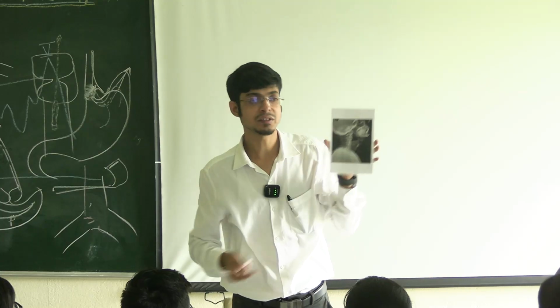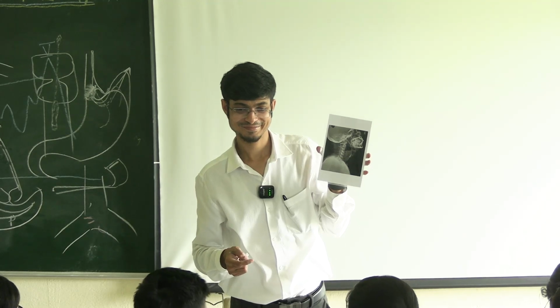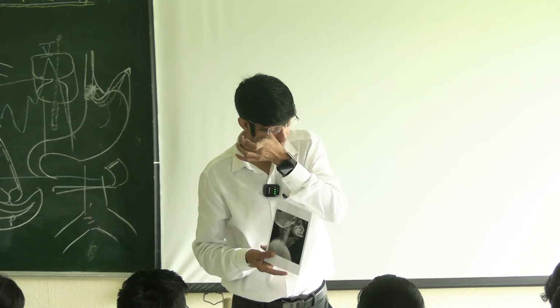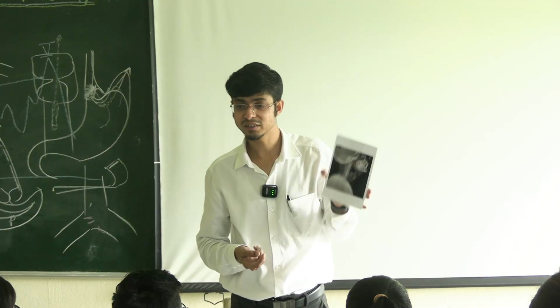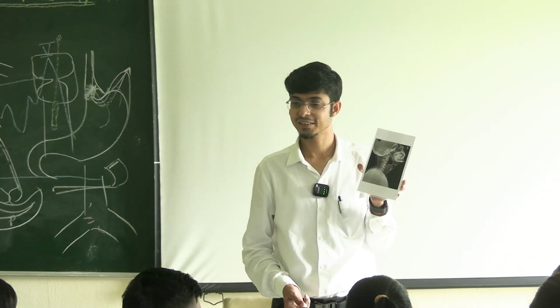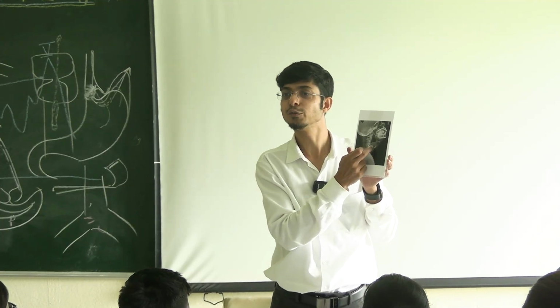What causes these air bubbles to be there? So what is in there? There is an active infection, right? So there will be microorganisms. There will be anaerobic organisms, anaerobic organisms. So what will they produce? Gases. Okay. So we will see these air bubbles inside the fluid part.